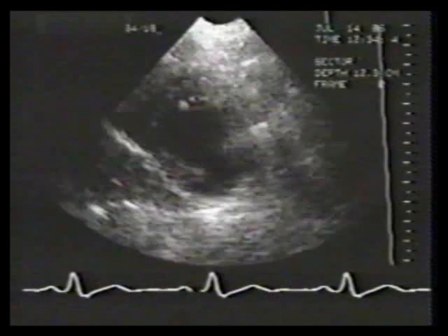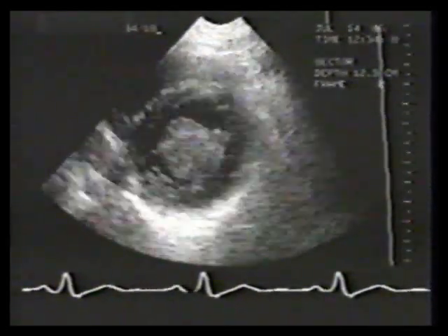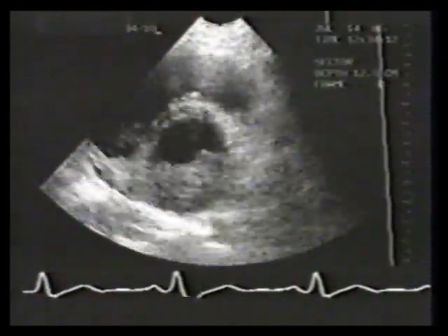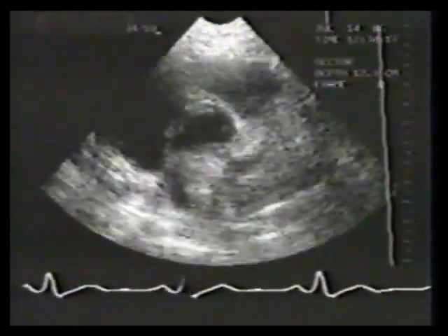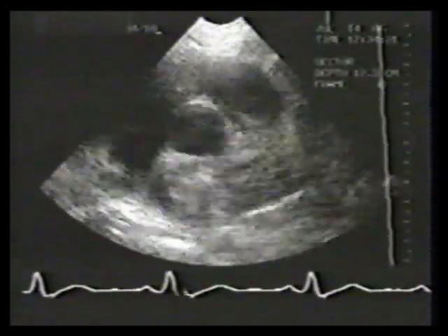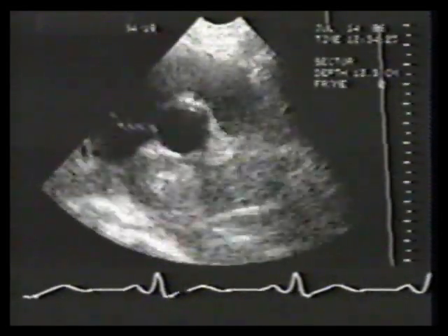Here, in the short axis scan from left ventricle toward the orifice of the mitral valve, note that the tumor is oriented laterally and in fact does not insert on the atrial septum. The fact that this tumor does not insert in the atrial septum should alert one to an atypical presentation. In fact, this is a metastatic osteoblastic sarcoma.